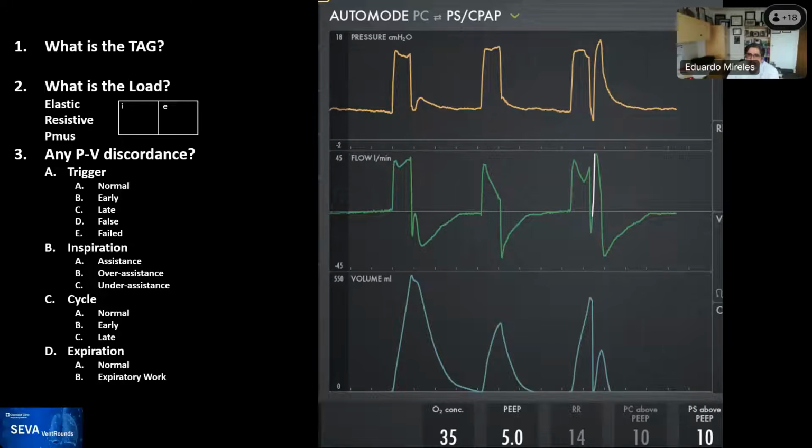And then many of you have put in that this is an IMV type of breath sequence. And Rob reminds you all that there's different types of IMV, and the one that this patient in particular is on, auto mode, is type 2, in which essentially you have mandatory breaths and spontaneous breaths, and the spontaneous breaths suppress the mandatory breaths.